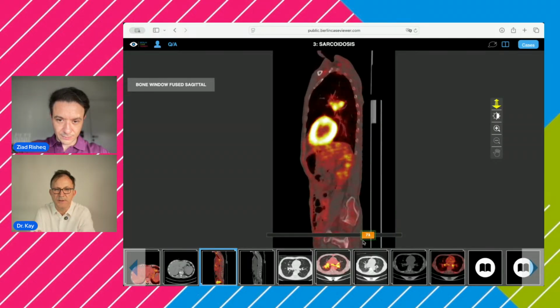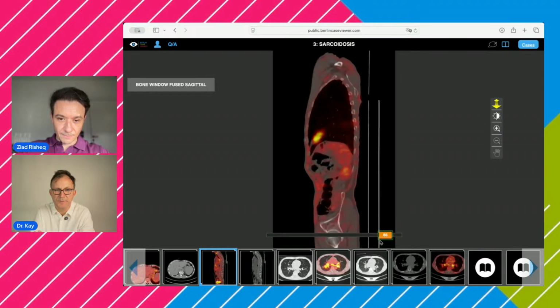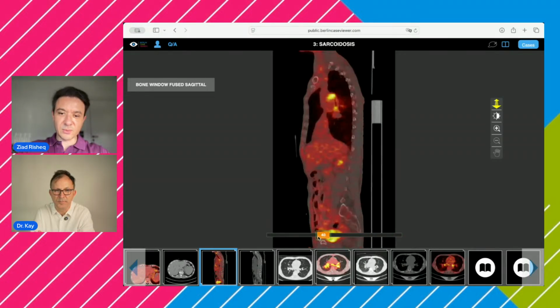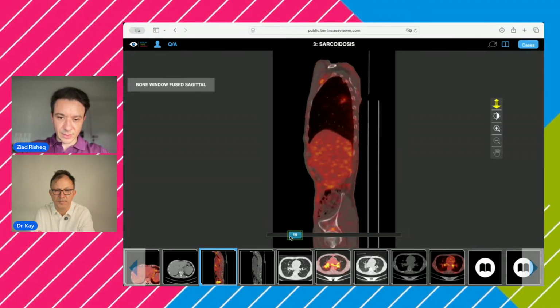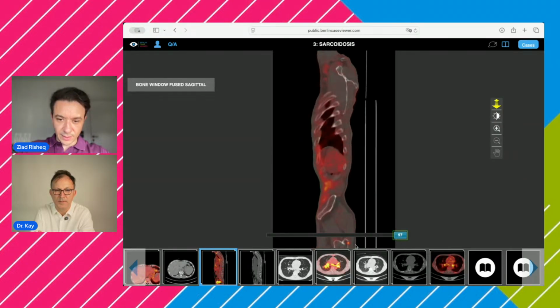This means you are regarding this as a bone manifestation of sarcoid? Yes, this was actually sarcoidosis. He had a biopsy. This was sarcoidosis. So you have an uptake in the acetabulum. This was a lytic lesion. And the greater trochanter that we saw earlier, this one, there was a focal cortical interruption.